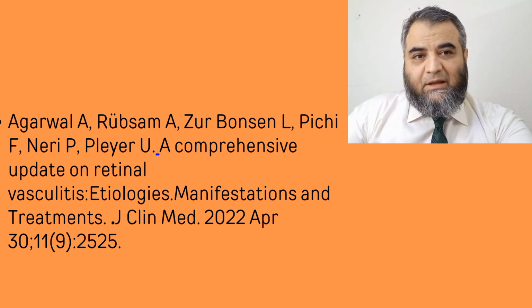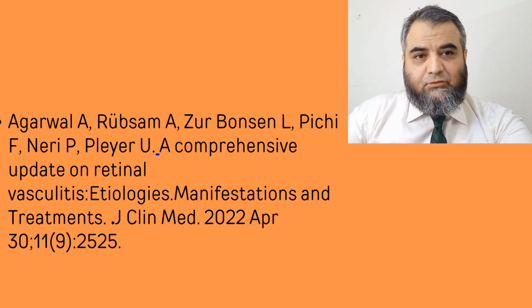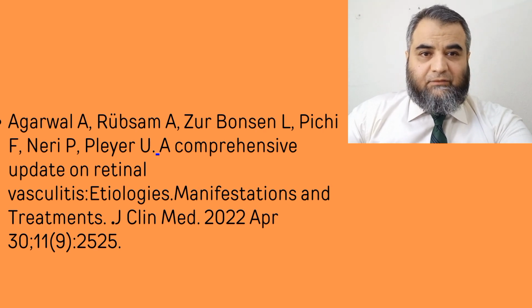But the purpose of applying the laser to the ischemic retina is that wherever there is ischemia in the retina, there is vascular endothelial growth factor production. These growth factors lead to new vascularization, and new vascularization leads to hemorrhages, leaking, exudates, ultimately detachment. So in the left eye we did peripheral scattered lasers. This was the treatment of the eye.